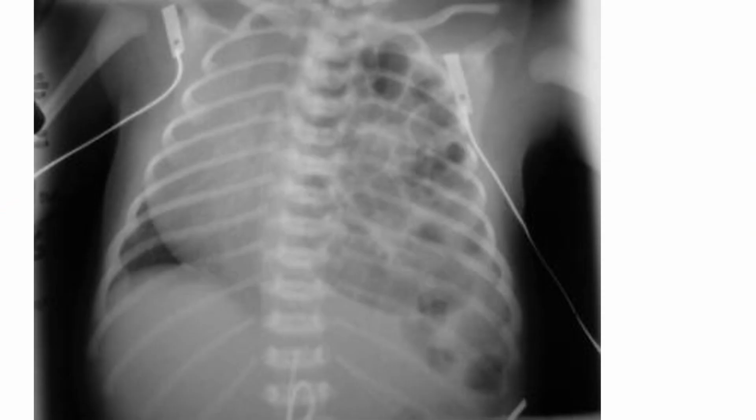Oh heavens, what's going on here? So when we're looking at this picture, what do you see? So hopefully some of you are like, this is a neonate picture. It is a neonate x-ray. And this is just an x-ray. But what do you see? What do you think this is? Here's a hint. You'll see scaphoid abdomen with that, and hopefully that means something to you.